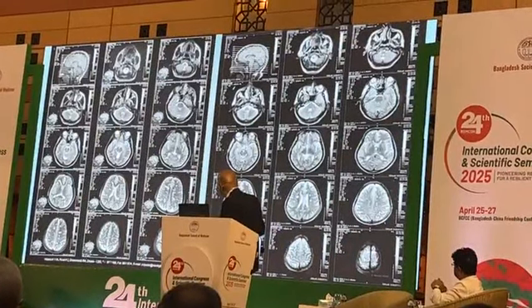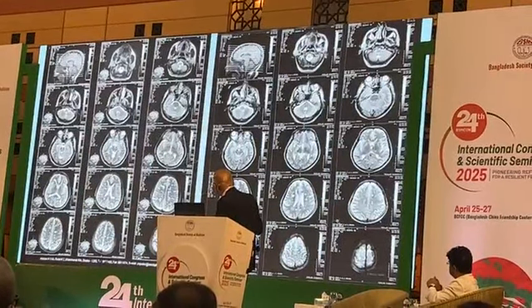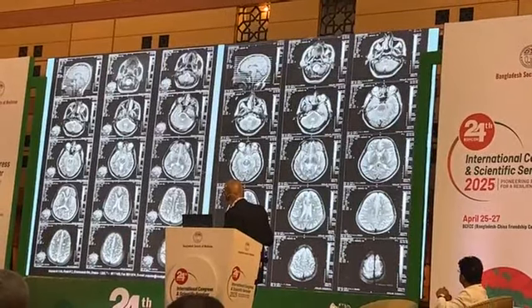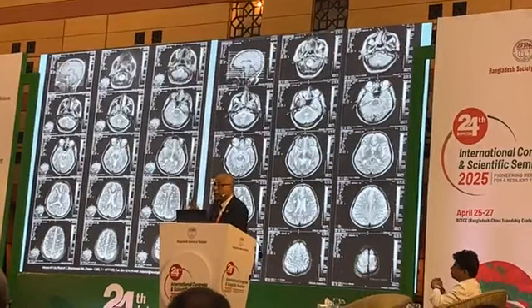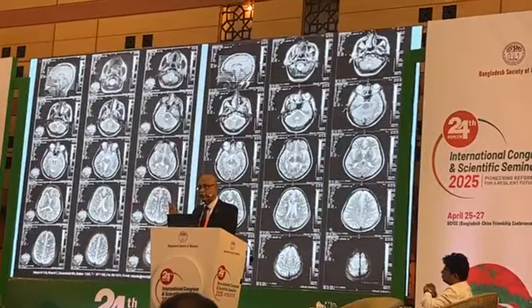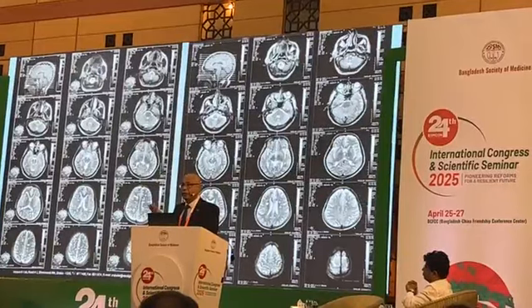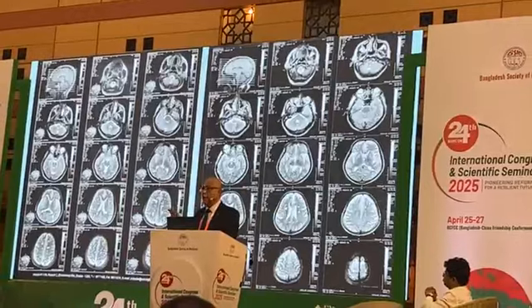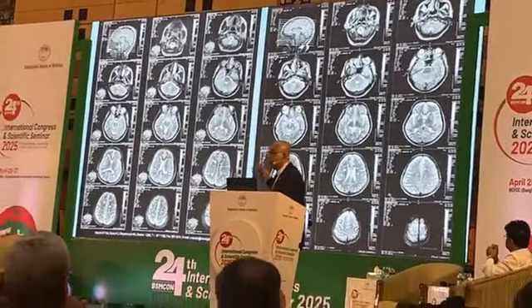This one is a bit away from the lateral ventricles, in a situation called gray-white junction. But more or less similar. In both examples in this situation, we consider only 4. Number 1 is multiple sclerosis, and always number 1 is multiple sclerosis in this situation. But second, consider vasculitides as well, and also neurosarcoid and CNS lymphoma. These are the 4 conditions that can give rise to a similar kind of MRI picture.